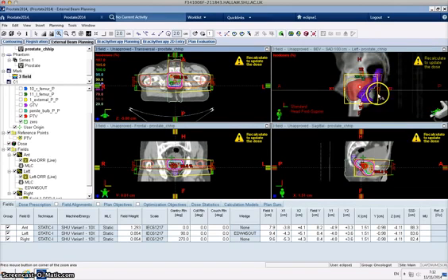So it's going to push dose in this direction, which isn't what we want. So what we need to do is to move the wedge by 90 degrees, and the way we do that is by moving the collimators. So if we move the collimators to 90 and then click OK, we can now see that the wedge is going from sup to inf.